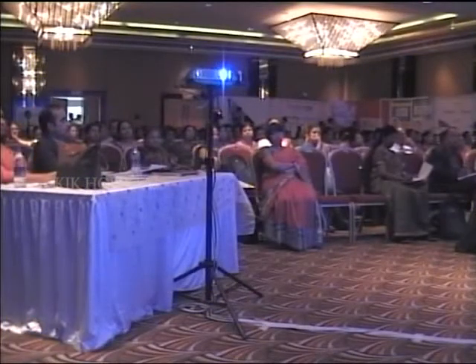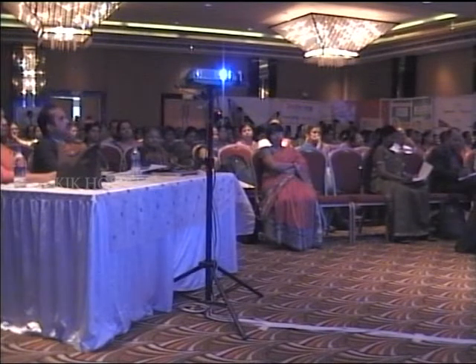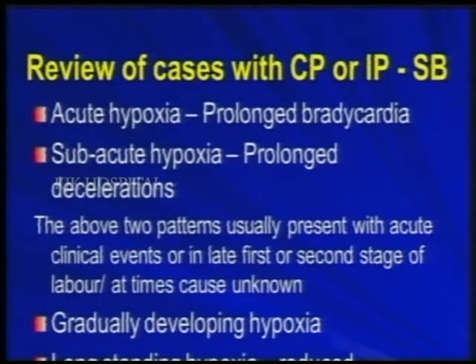Whereas subacute or prolonged decelerations comes back to the baseline, but for a very short time, for 30 seconds, but the deceleration lasts for about 90 seconds to 2 minutes. And here the pH will drop by 0.01 every 2 to 3 minutes. So the baby has to be delivered by 45 minutes to 1 hour. Now these are very common in the second stage and when there is some acute incidents.